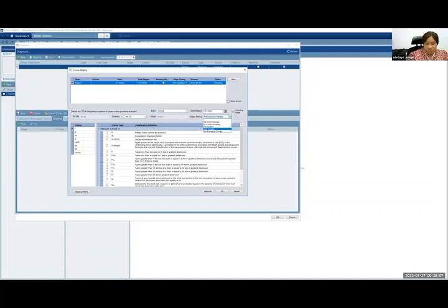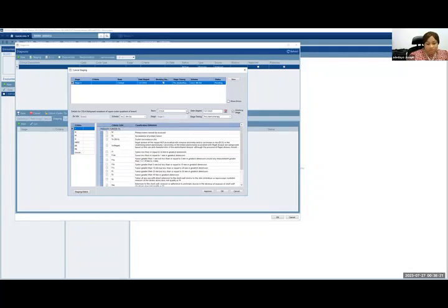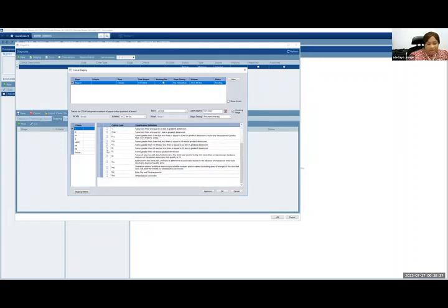But I'm going to choose, let's see, this is a new first appointment. I'm going to select pre-chemotherapy. So now the staging criteria. For the T status, because we've selected clinical, it's showing you the primary tumor. If I toggled this to pathologic, you would see, sorry, if I toggle, so we're on clinical. So if you go to T stage, you have all the T stage options up here. And then I'm going to select T4.